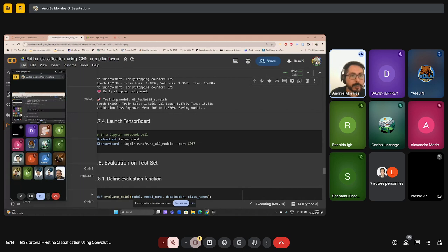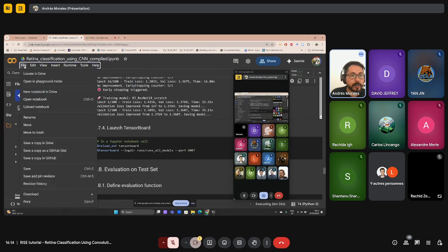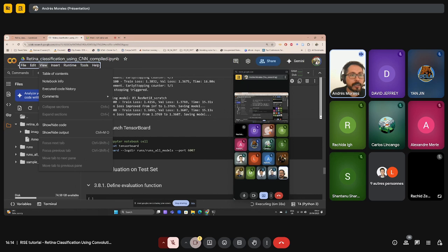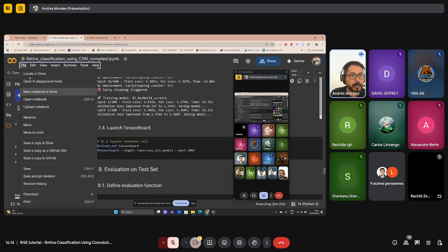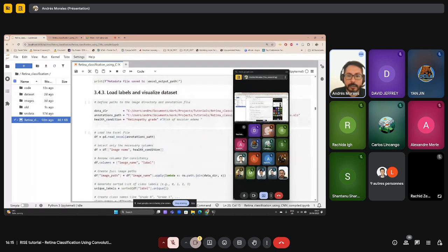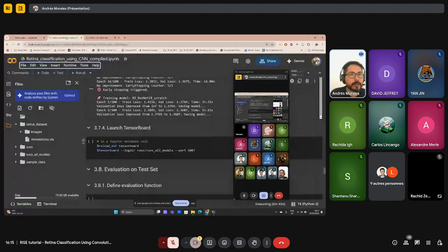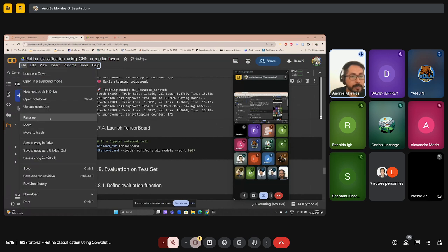So let me just quickly open the notebook that is already calculated so that we can see the results, and I will guide you through them. Just one second, only because of the time.